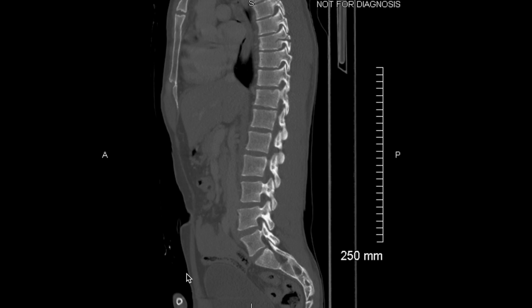All right, so now we're here at the bony windows, sagittal image, contrast enhanced CT, and the first thing that you'll probably notice is there is a horizontal fracture here along the T8 vertebral body, and in particular around the posterior elements. This patient I also intentionally left out is another case of trauma. So this actually happens to be the same patient that we saw in case 1.